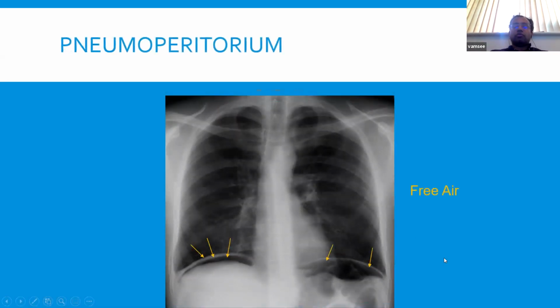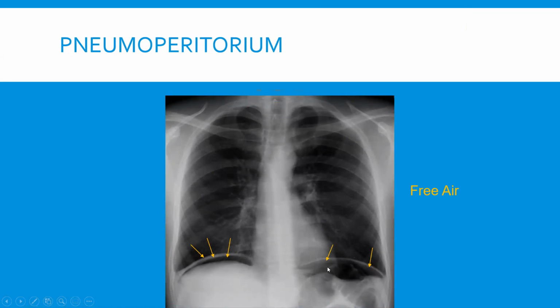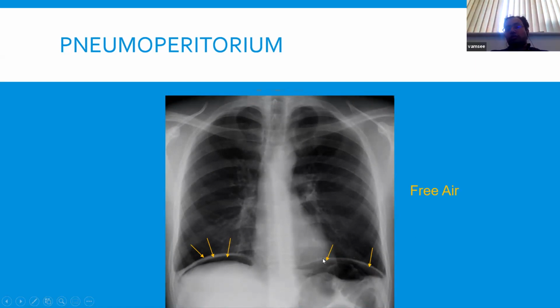One fact I do want to mention is that you've also got a bit of bowel loop here, which in itself is not that abnormal. I suspect there's actually gas on both sides here, because normally with the gastric bubble, you wouldn't see this smooth pattern going all along the hemidiaphragm. So you correctly identified it's clear pneumoperitoneum under the right hemidiaphragm, but there's probably also gas on the other side as well. It doesn't really change the diagnosis of the patient.